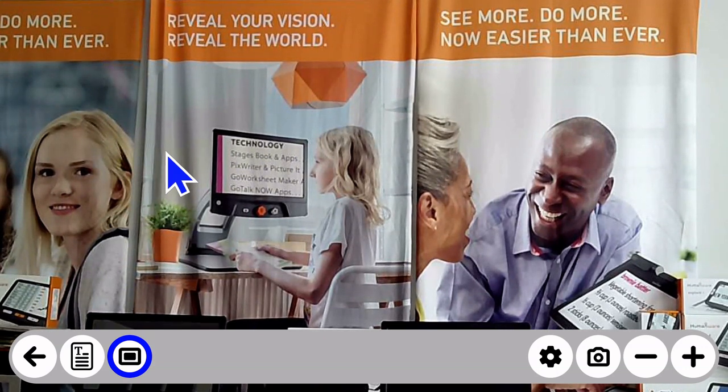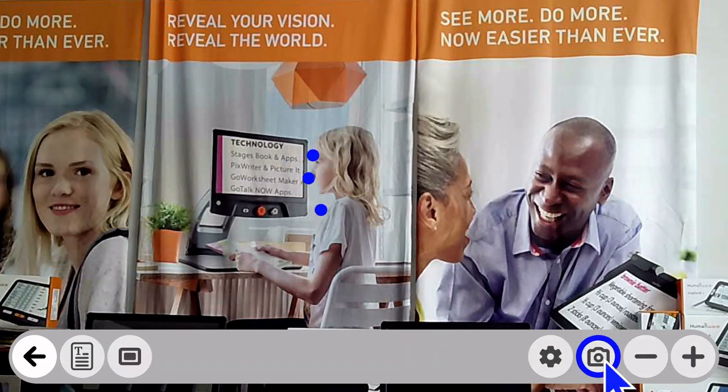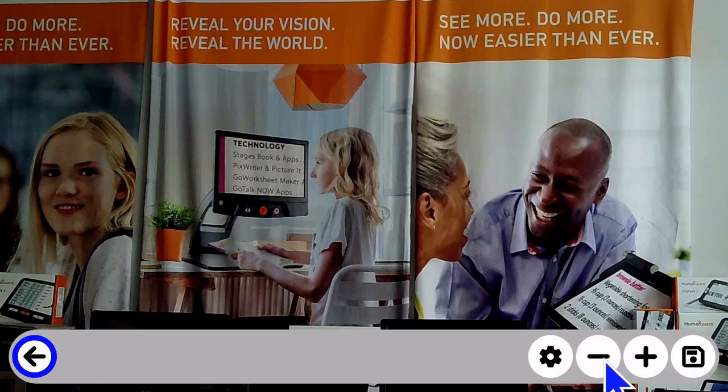Okay, so we've been through the primary interface of the live camera. Allow me to quickly capture an image. I'll go to that camera icon. It's the third in from the lower right, and I'll tap on that once and we'll capture an image with our distance camera now. So now we have an image that we can zoom in and zoom out upon.